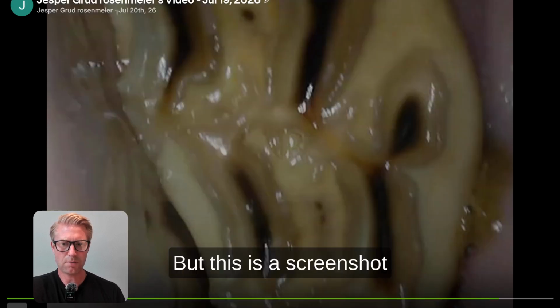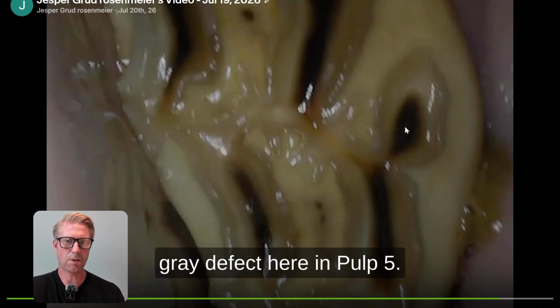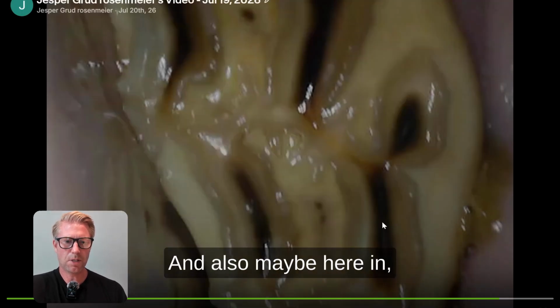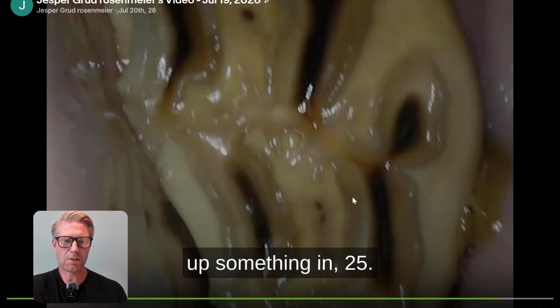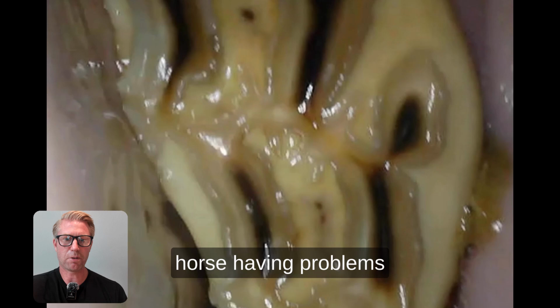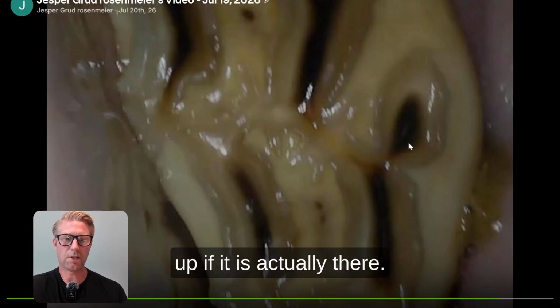But this is a screenshot from the examination in 25, and these pulps look quite fine. The only thing is there might be a small gray defect here in pulp 5, and also maybe here in pulp 3. So this makes me wonder if I could have picked up something in 25, but also in 25 there was no history about this horse having problems as there was in 26. So I didn't pick this up, if it is actually there.